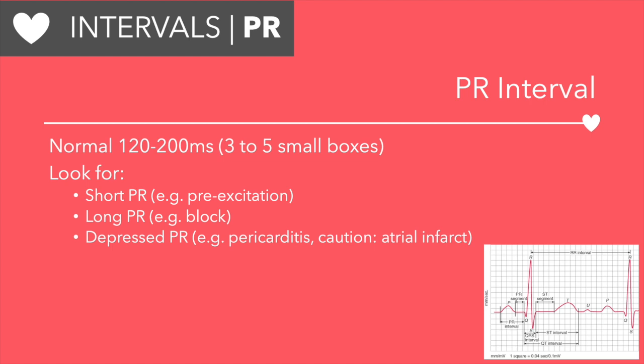Let's talk about the PR interval. The normal is 120 to 200 milliseconds. This is 3 to 5 small boxes. We want to look for any short PR, long PR, or depressed PR.